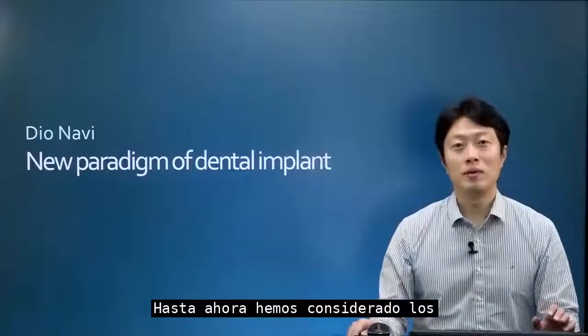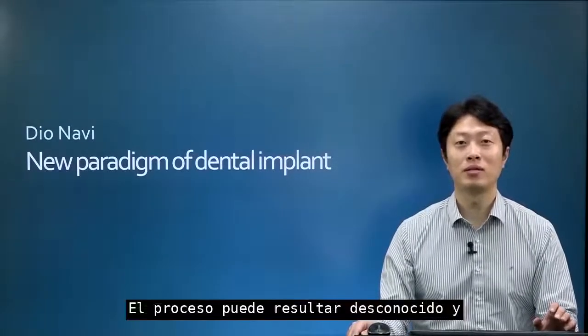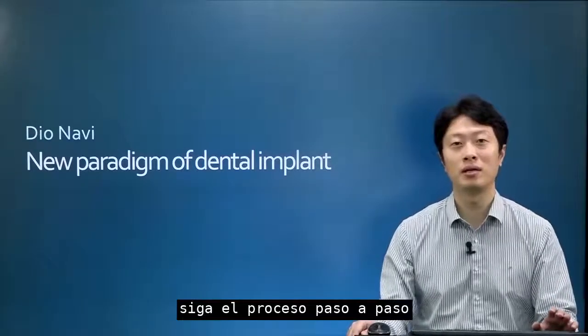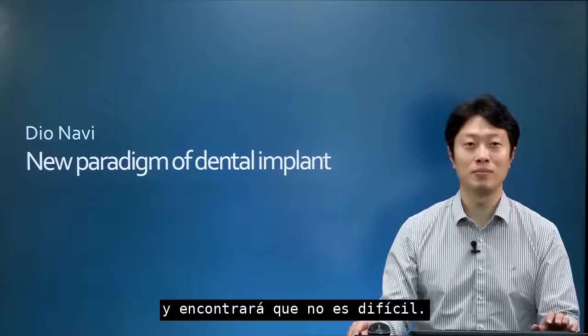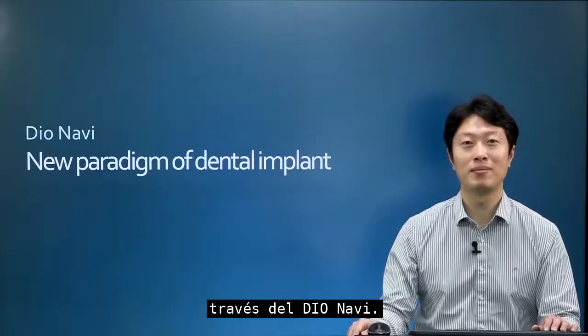We have so far considered the basic principles of DIOnavi surgery. The process may be unfamiliar and difficult at first. Follow the process step by step, and you will find that it is not difficult. I hope you have successful surgeries through DIOnavi. Thank you.